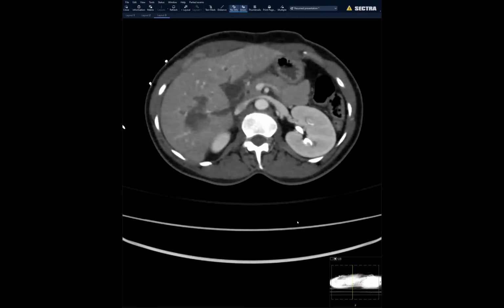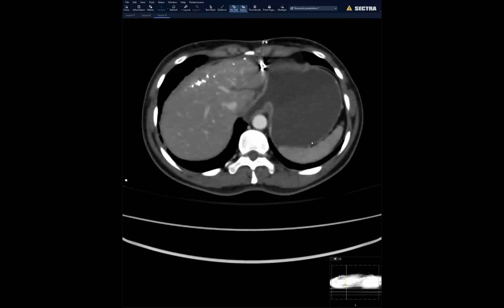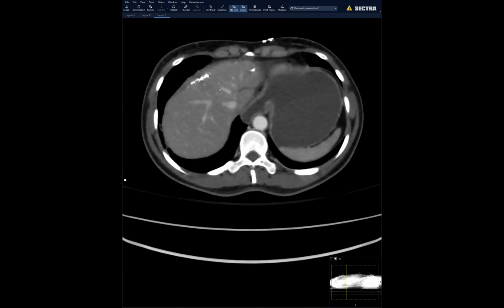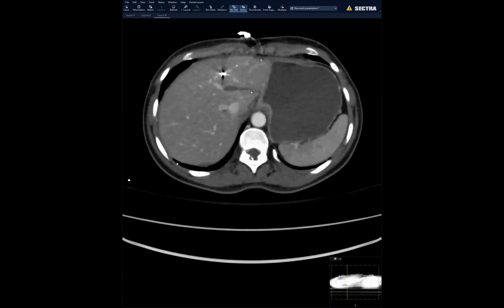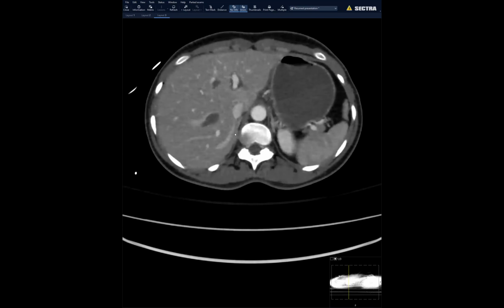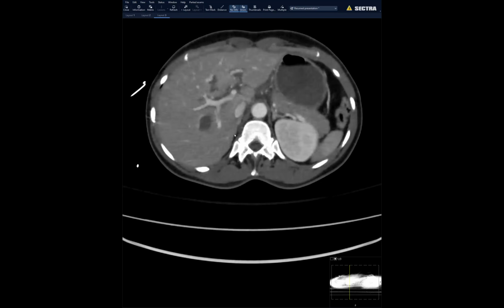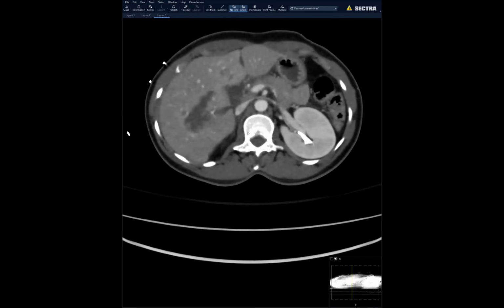Very cool. Aarti, I have a companion case. Okay, this was a young patient. She had a remote history of gunshot wound to the abdomen, so these clips and suture material are all from that time. But more recently, she was found down in a pool of blood per history. So there was suspicion that there was some kind of altercation, and she was just found down.